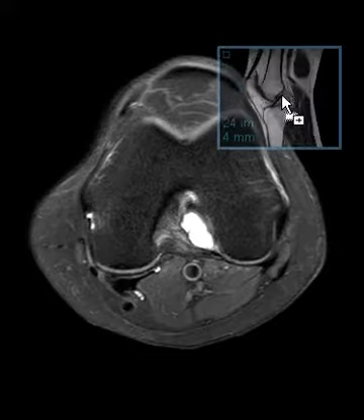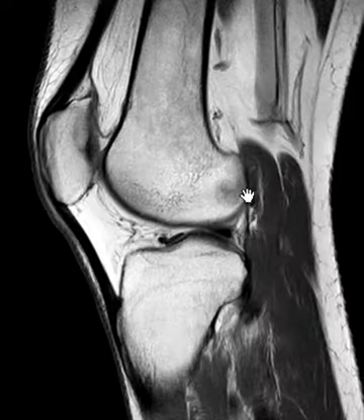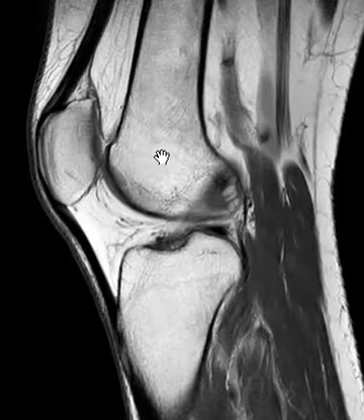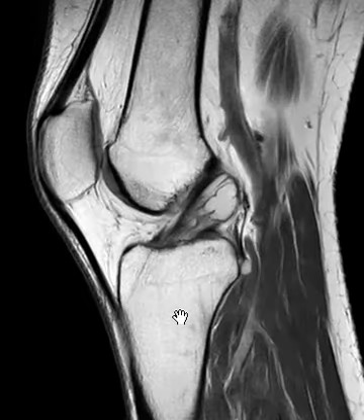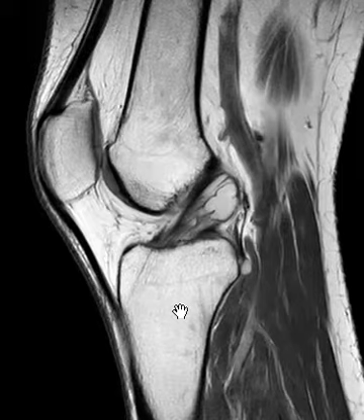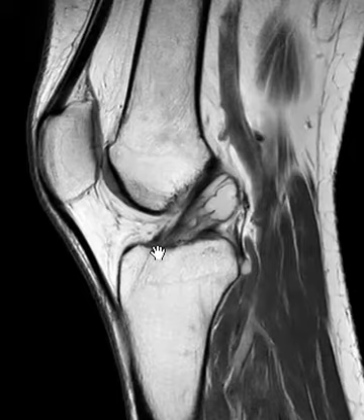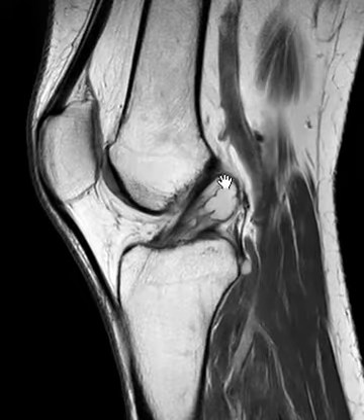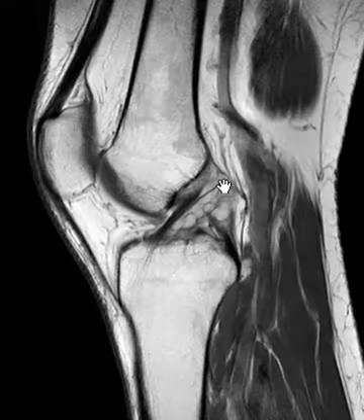So if we put up a sagittal view, basically a side view, we can see the kneecap here on the left. We see the femur here. We see the tibia down below. Now we're going to find that ACL. So this is the anterior cruciate ligament. It comes obliquely from the back of the femur to the front of the tibia. It limits the tibia from moving anteriorly. And we can see that behind it, intimately involved, is this lobulated septated fluid collection.